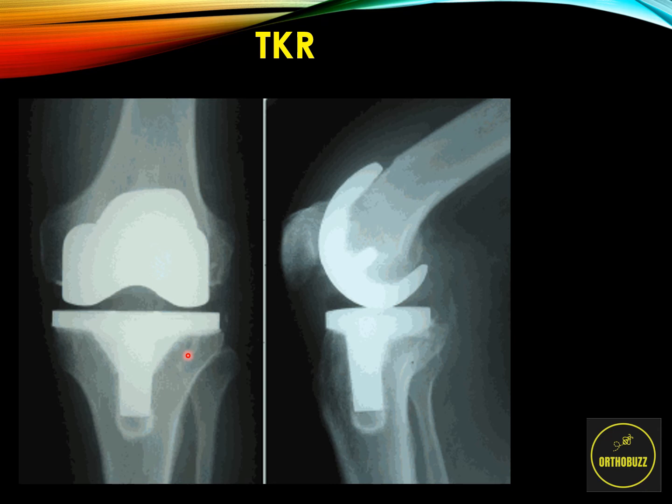As we can see over here, this is a total knee replacement. We replace the tibial plateau aspect, we replace the distal femoral aspect, and what appears to be a space in the middle is filled with a polyethylene to simulate the articular cartilage. We can see that we use this fluffiness around the components here, which is cement, both on the tibia and the femoral aspects. A knee replacement is a big undertaking to have, which requires physiotherapy afterwards. However, for people with severe arthritis, it can offer them the pain relief and the mobility to allow them to function at a good level again.